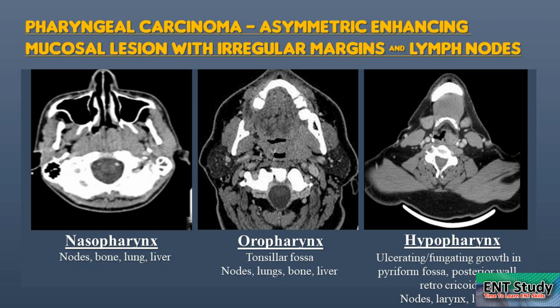The malignant otitis externa that we saw, I was wondering where the vessels on this side went. So you have to wonder: these vessels, these whitish dots, 3 whitish dots are here and here also. If these white circles are not there, then this is dangerous. If they are not on either side. Secondly, all this should be very black.